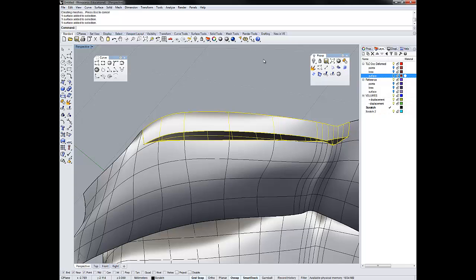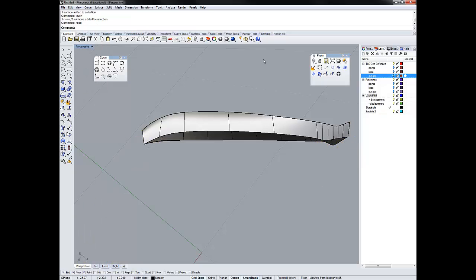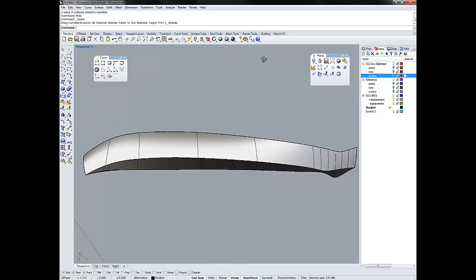This is a command that we're going to use pretty often. So I'm going to type invert, and that inverts our selection. And I'm going to type hide. So hide will just simply hide our objects. And then I want to center, so I'm going to move over here and type zoom extents.